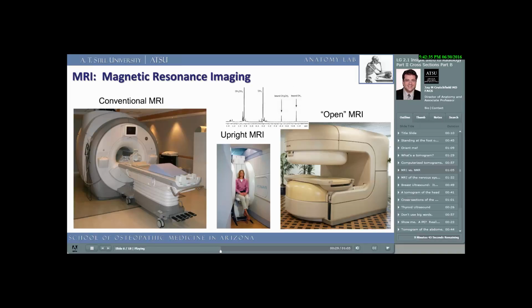Here we see three types of MRI scanners. The one on the left is the closed MRI scanner. The right is an open scanner. And the newest addition in the center photo is an open upright scanner. Open scanners usually have weaker magnets and produce images suffering in resolution. They're not as strong and the image quality is not as good. Closed MRI scanners, which generate a better picture, are usually quite claustrophobic, hence the reason many patients need sedation. Patients who are severely claustrophobic will do much better with an open MRI scanner.